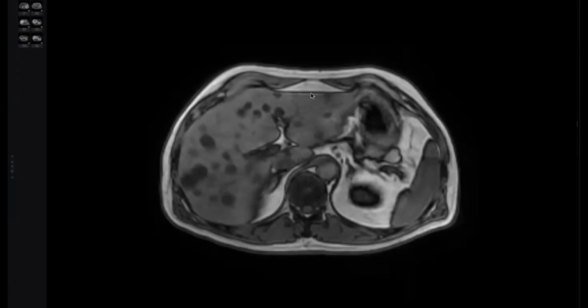This is the real MRI physics. These voxels during acquisition, the machine doesn't know if this is fat or water, so it represents this area by a dark line. Okay, this is chemical shift giving the black Indian ink sign.